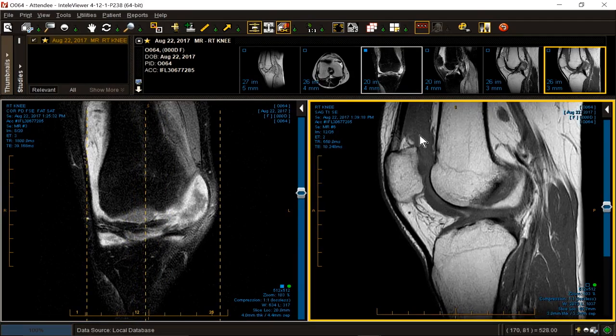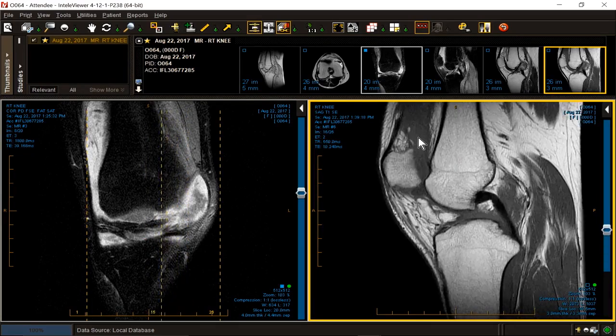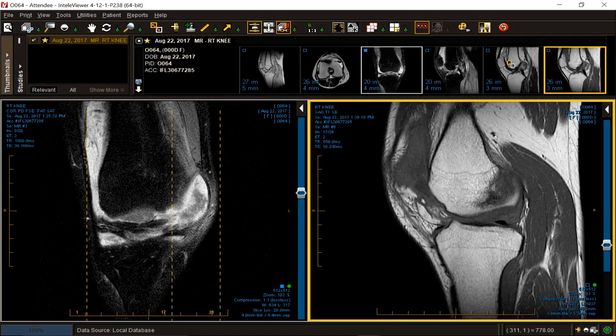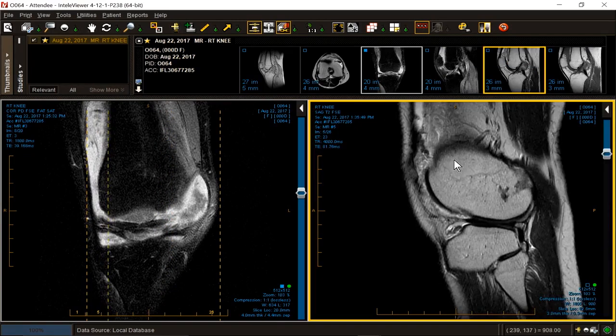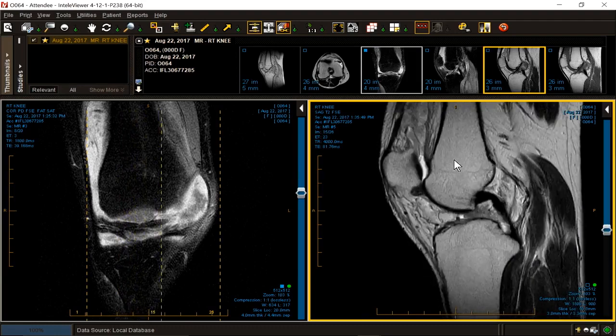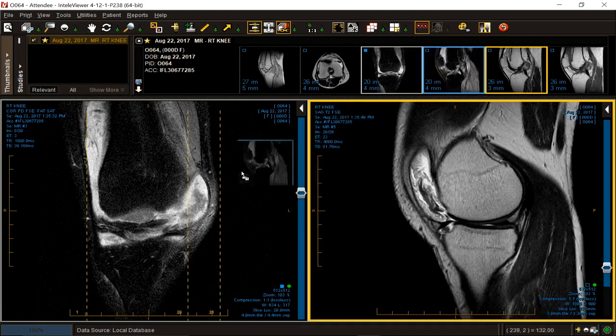First of all, it's a true T1. What do you think of the effusion? Very proteinaceous or blood-tinged, isn't it? It's not simple fluid. Let's put up the T2. Wow, the T2 is impressive. We don't have a gradient, unfortunately.